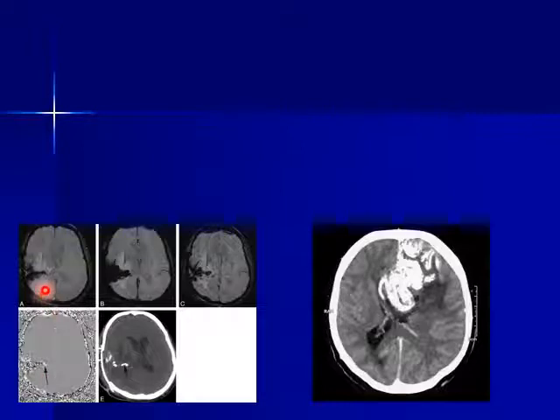Sometimes in the left-handed magnets you see blooming of calcification, black in the image of SWI and black in the image of the phase images. To help you easily, take the internal cerebral veins as a reference, okay, to differentiate hemorrhage from calcification. Look here, calcification is black and the internal cerebral veins are black, okay?